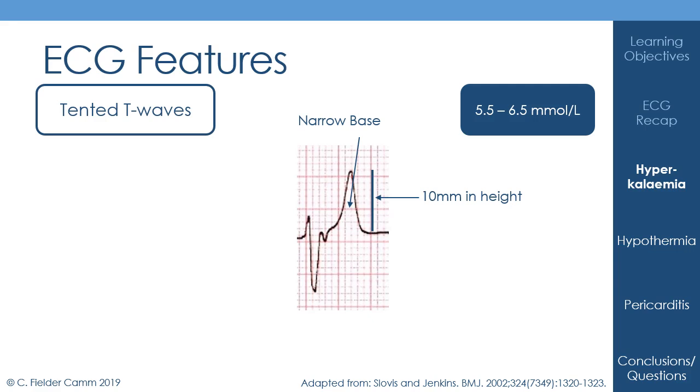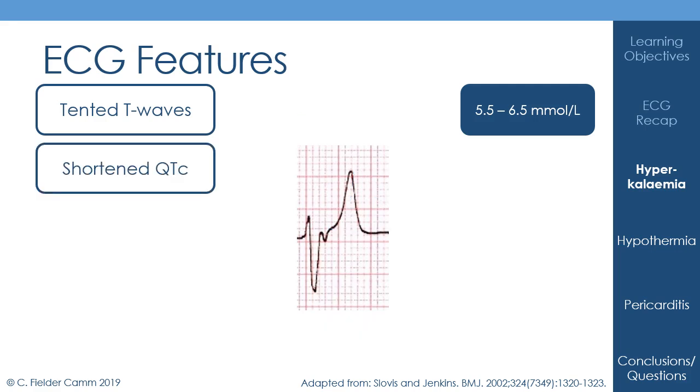And it looks like if you were to sort of press your finger down on the top of that T wave, that it would hurt, which is very different from a normal T wave. And its total duration is really quite short, at about 160 milliseconds here.